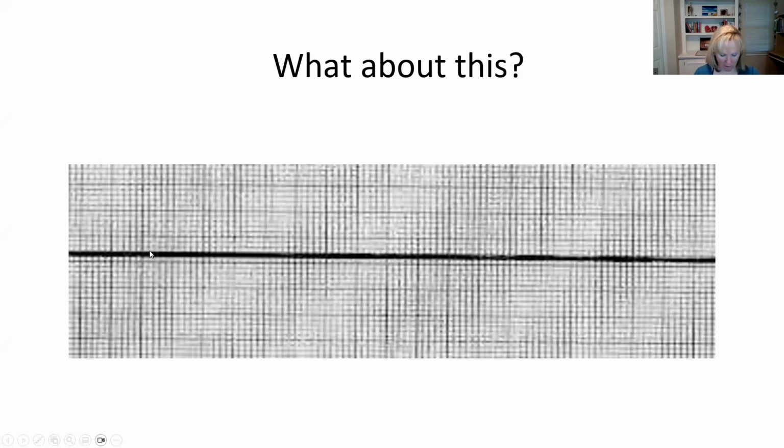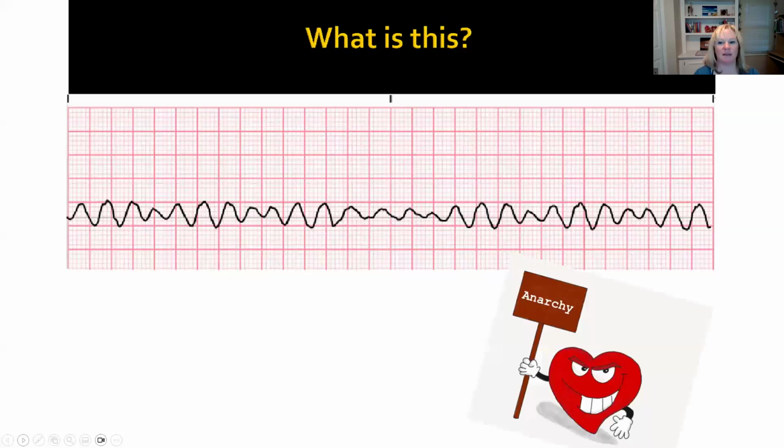This is called, are you sure the patient's on the monitor? I like the skull and crossbones. The sad face, yes. This is called asystole. You guys are cracking me up. This is VFib. We talked about that already.